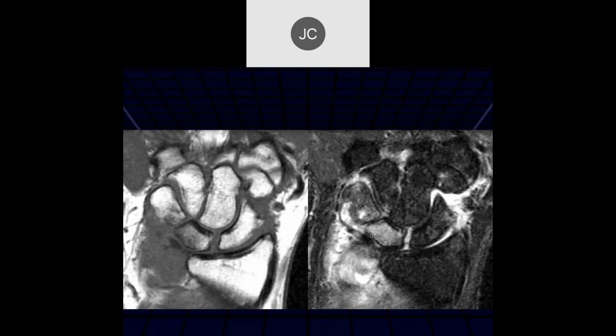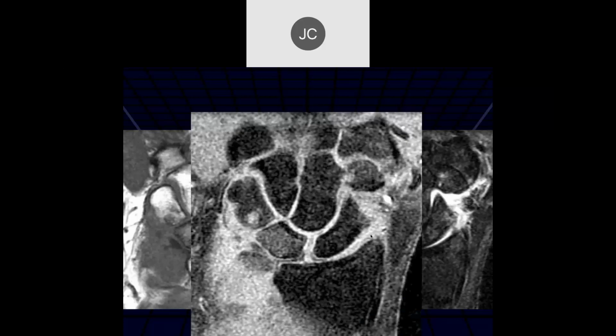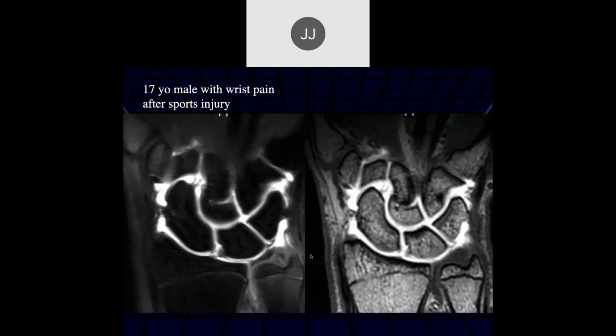We've got some bone edema there, huh? Yeah, just a lot of amorphous tissue. And then you can see a defect in the membranous portion of the scapholunate ligament. And we really need to look at the axial images to look at the dorsal and volar. Okay. Is that blood there, John? I don't think so, John. I think that's just soft tissue edema.